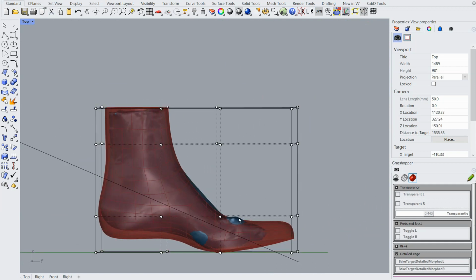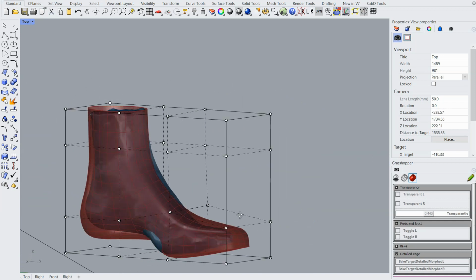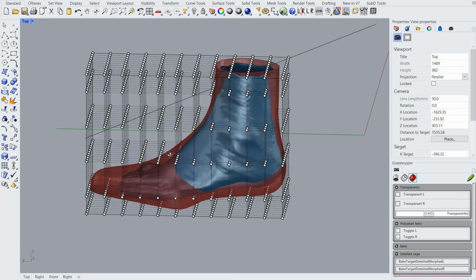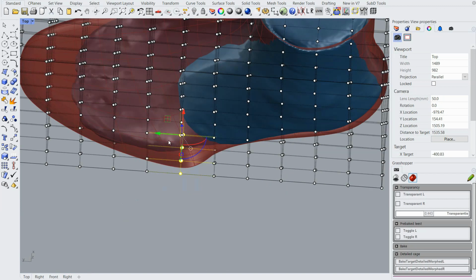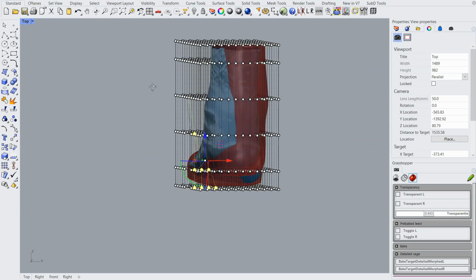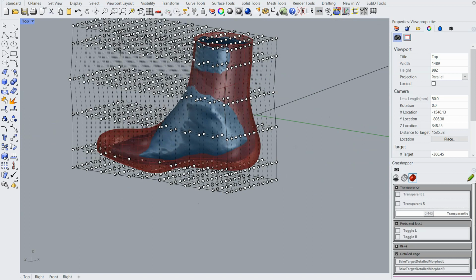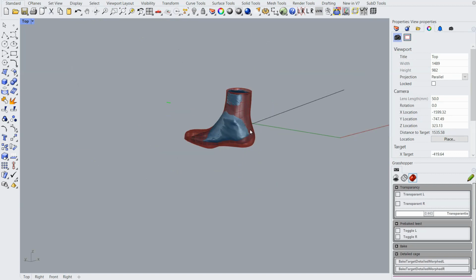And when I want to give extra room here, well, it simply doesn't react the way I want it. I can put it in a cage with a lot more control points, but things get only more complicated, and well, it's very difficult to achieve what I try to achieve with this system. So what I need is a cage that has more or less the shape of a last.